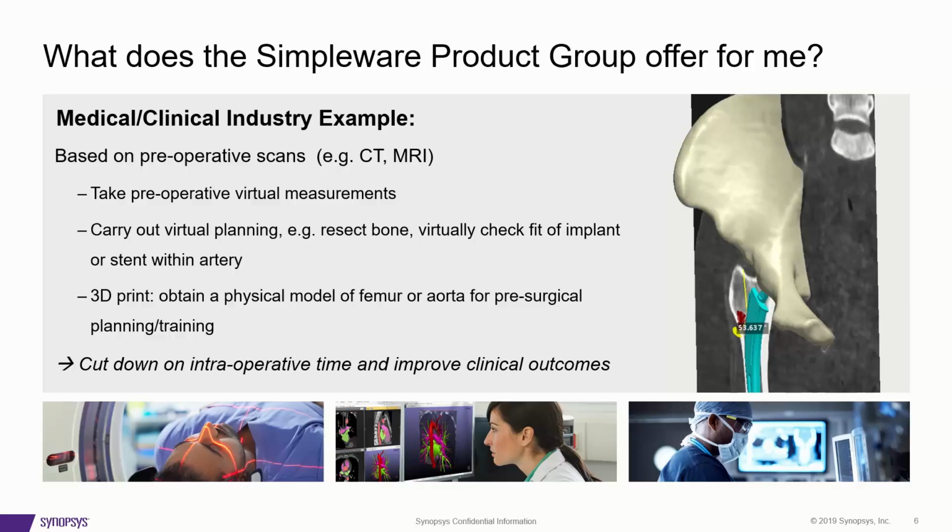So we're able to use our tools to segment the structures, the anatomy within those scans, as quickly as possible. We've just recently introduced a very exciting tool for the automated segmentation of orthopedic structures, so the hip and the knee. So we're able to automatically segment these anatomies and then use automatic landmarking that's completed within that process to take measurements from certain areas. But we're also able to do a lot of more manual type measurements that can aid in the planning process.